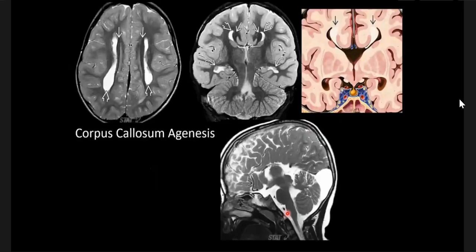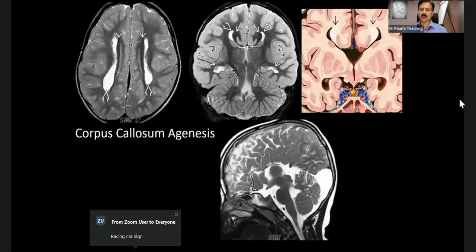Okay. This is corpus callosum agenesis. Basically, when there is corpus callosum agenesis, the lateral ventricles at these levels are widely spaced and parallel to each other. Now, if you see a coronal, but no examiner is going to show you a coronal, they will always show it on an axial. It gives you that Viking head or moose head appearance. So this is where the corpus callosum is absent, and these are known as Probst bundles.